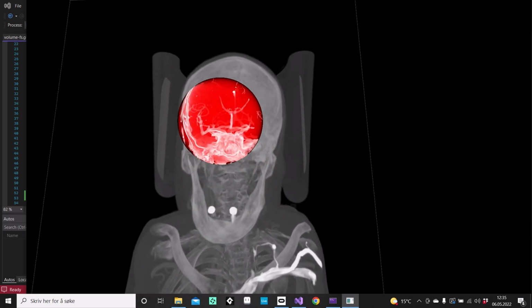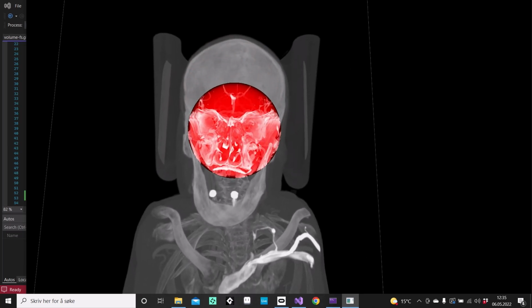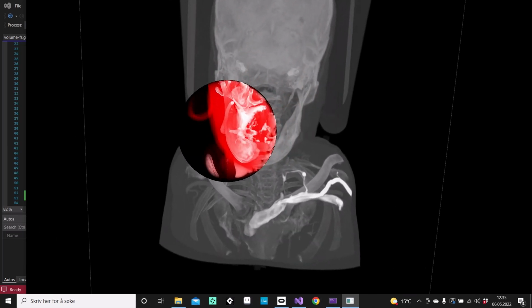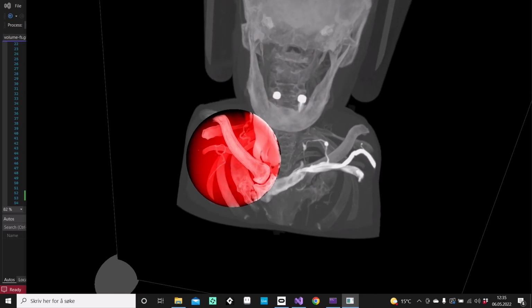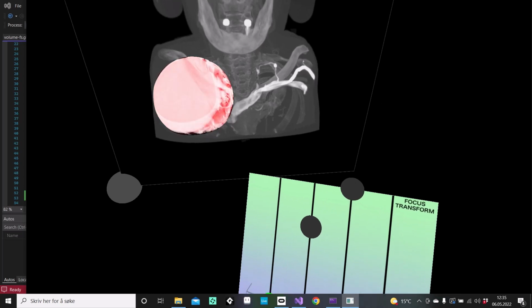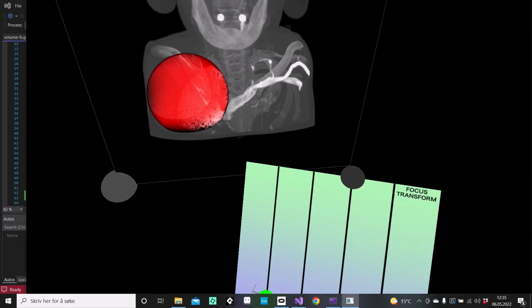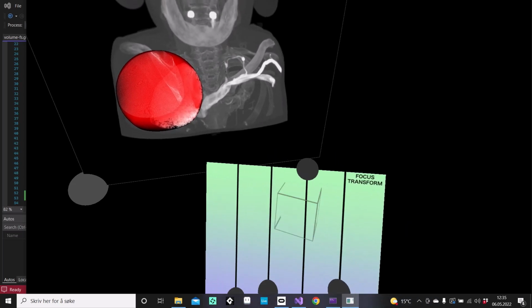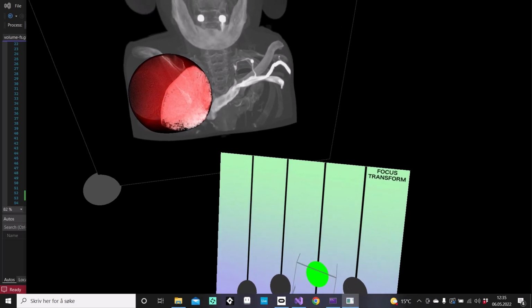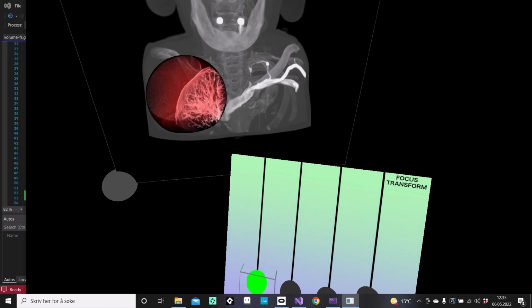I came up with this focus tool. You move it around in the volume to look at points of interest. Let's say you want to look at the lungs. You move it into place, then you use the dedicated focus sliders to find a center value and a range that suits your needs. You can use the density slider to remove some of the semi-transparent material.